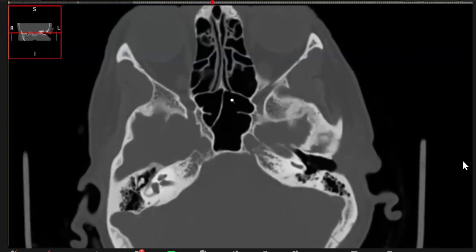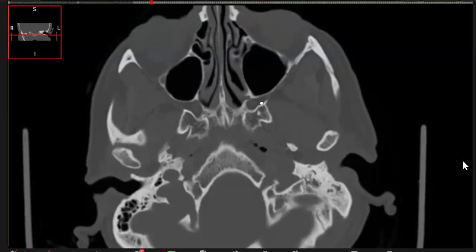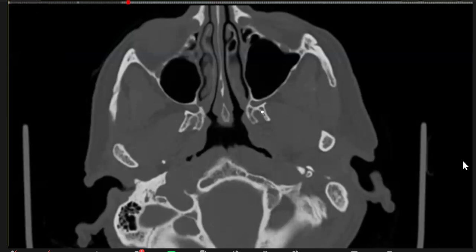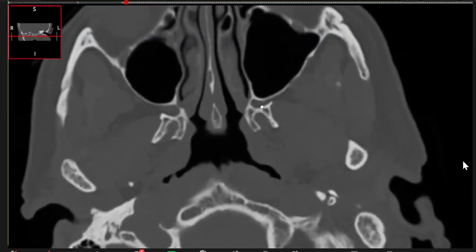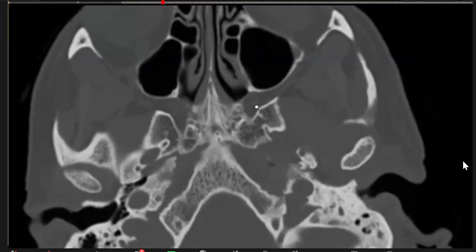Medially, it communicates with the nasal cavity. So this is the fossa where I am pointing. The pterygoid plates are here. This is the maxillary sinus. And look at this space. This is the space we are talking about. Now, medially, it communicates. There is a bit of mucous membrane in a living person there, but some nerves go there.